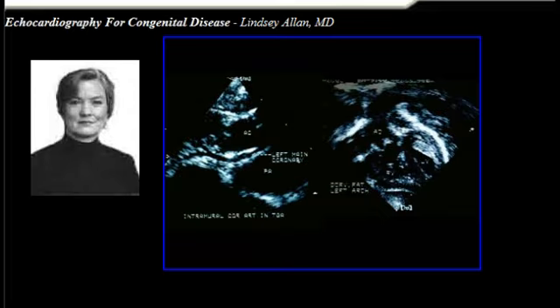One of the difficulties sometimes with complex cardiac anatomy is that the techs or the fellows get so excited about the complex intracardiac anatomy that they forget to look at what's important. And here's an example here where we had a newborn with complex intracardiac anatomy and double outlet right ventricle. Well, the aorta was arising from the right ventricle. There was no pulmonary artery arising from the right ventricle.